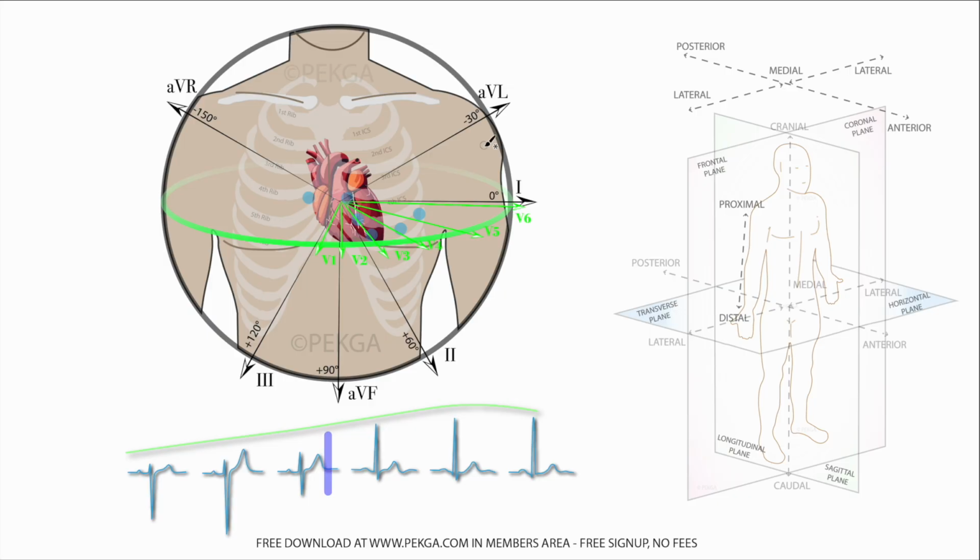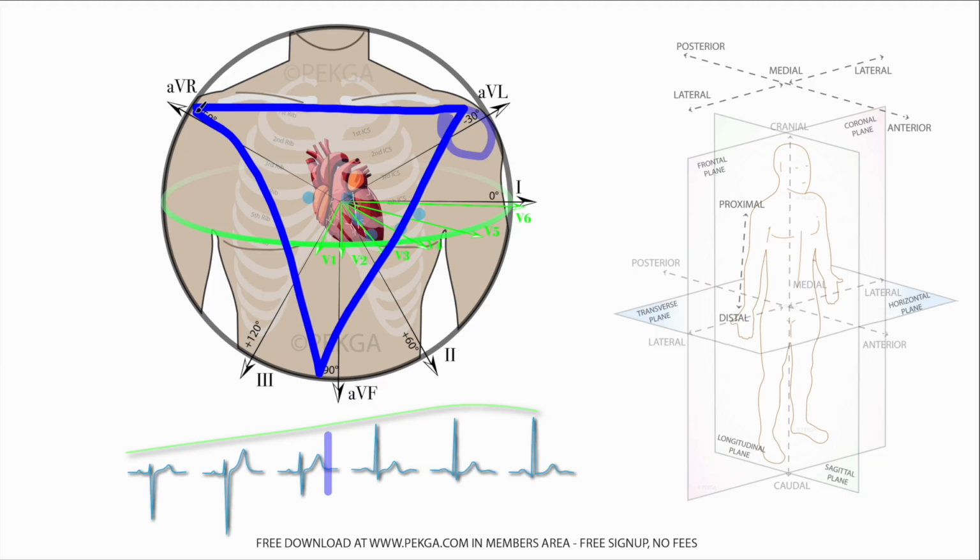However, they do correspond to the electrode that is placed on the left arm. So the first one that I would check is whatever's going on over here. That electrode could be down here on the left arm as well, wherever you placed it. Einthoven's triangle, right? If we were to draw it on here, it looks like that.